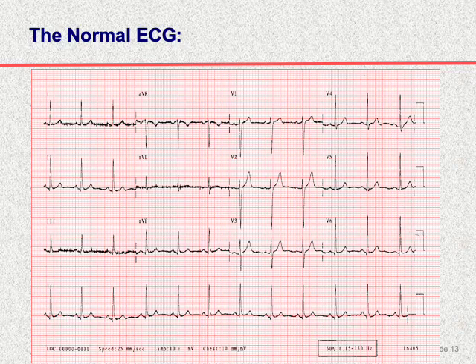If it's sinus, we will say this is a normal sinus rhythm. Why is it sinus? We look at lead 1 and lead 2 and see the P wave is positive. The other thing, each P wave is followed by an R wave, and this PR interval is normal and constant. Normal PR interval is between 3 and 5 small squares, let's say 120 to 200 milliseconds. As we see here, it does not exceed 1 large square or 5 small squares.